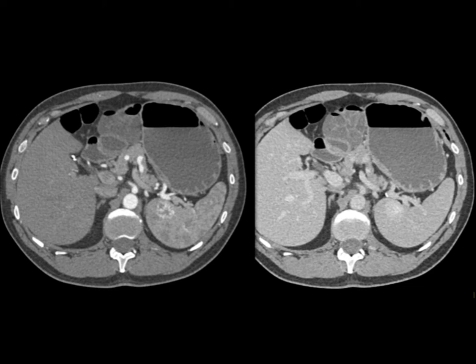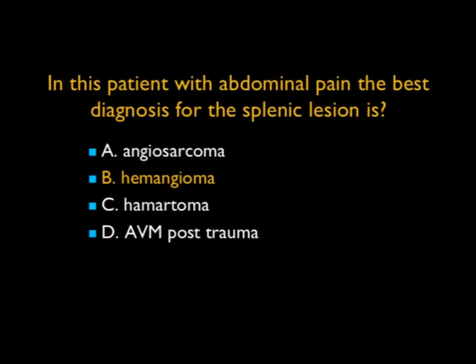This is the classic appearance for hemangioma. It's one of those splenic hemangiomas that behaves somewhat like a hepatic hemangioma. Just a very nice example.